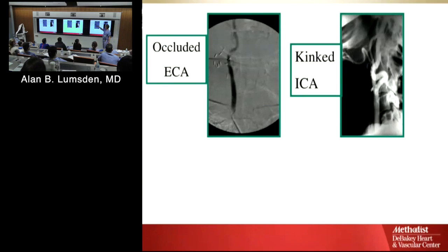All right, so there's a bunch of artifacts up here, or it could be staples, which tells you the patient's been operated on. So all bets are off. What is that, you think? What vessel is it? Or what region of the body are we in? Neck. We're in the neck.